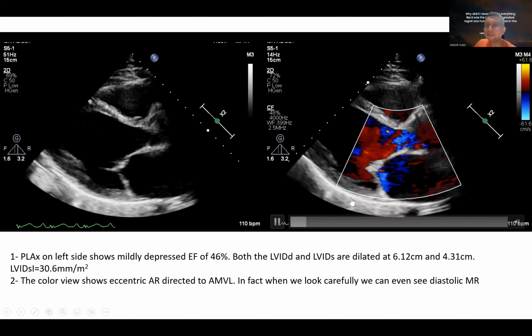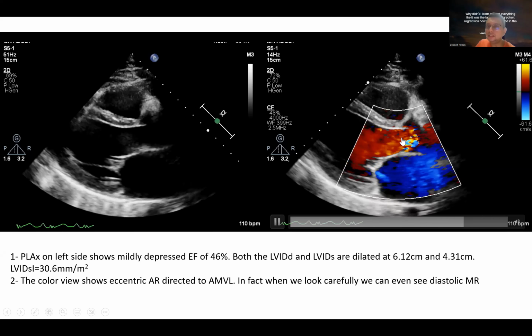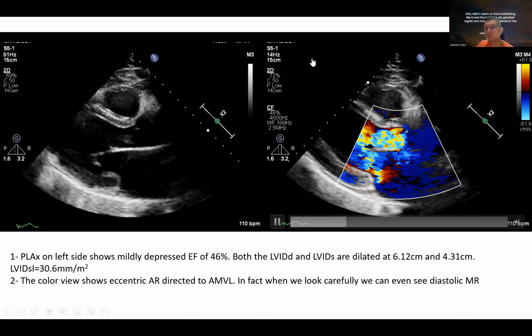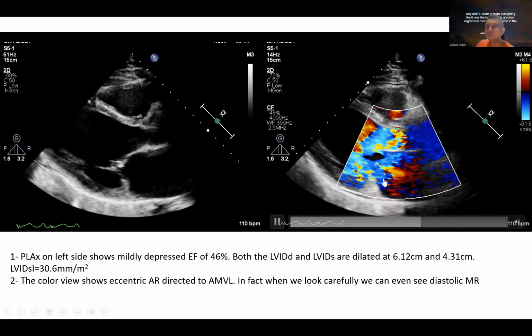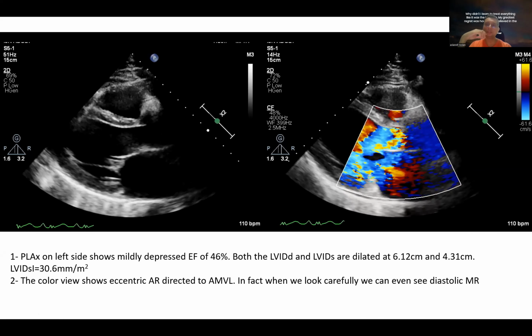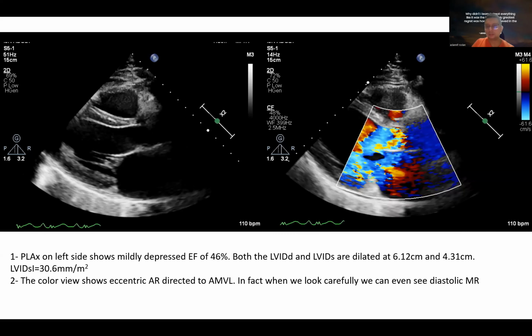As you can see from this right image here, the jet is directed eccentrically, directed to the anterior mitral valve leaflet. We also see mitral regurgitation, and when we see someone with poor ejection fraction, dilated LV, and mitral regurgitation, most likely this is LV functional mitral regurgitation. So the MR is because, as the LV dilates, it pulls up the papillary muscle, and as it pulls up the papillary muscle, it pulls up the leaflet, and it causes tethering and tenting of the mitral valve leaflet.